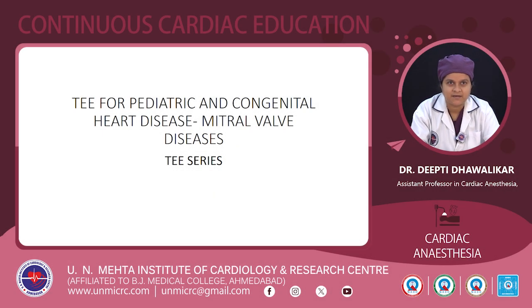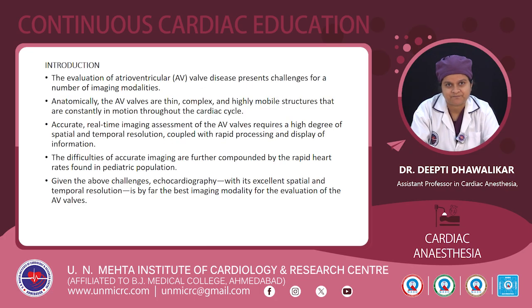TEE series. Today we'll see TEE for pediatric and congenital heart disease, basically considering the mitral valve. So now, the general considerations while evaluating the mitral valve in pediatrics. The evaluation of AV valves presents a lot of challenges for a number of imaging modalities.